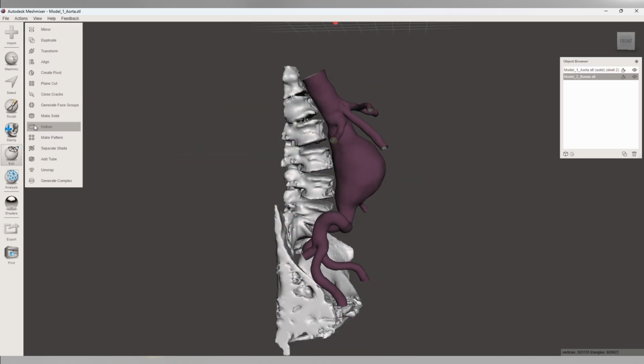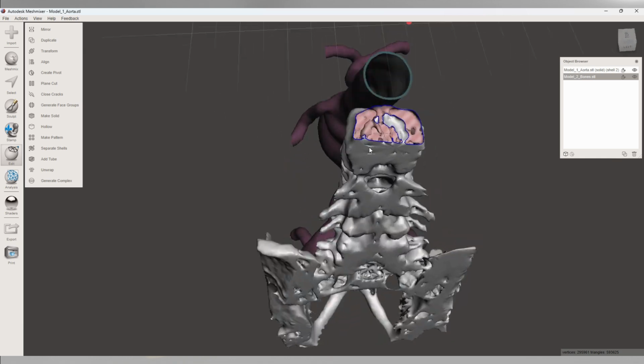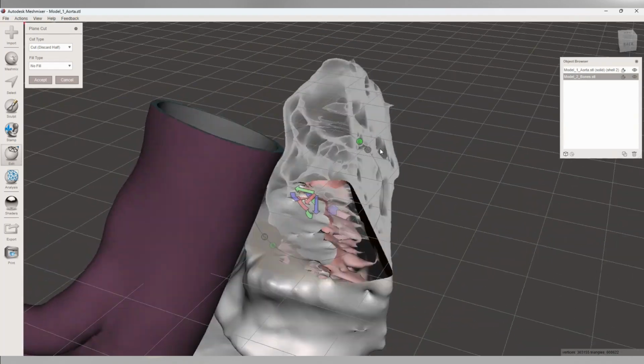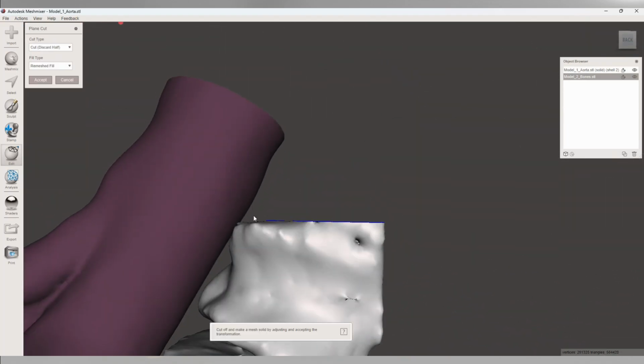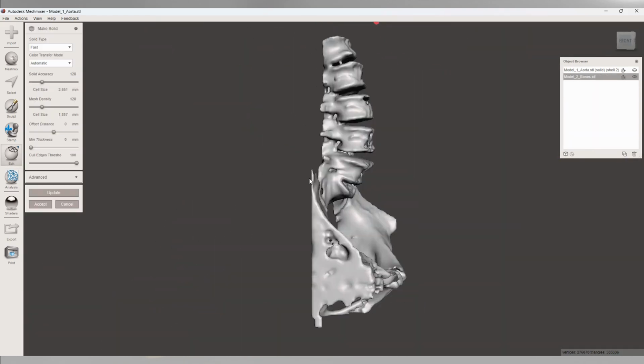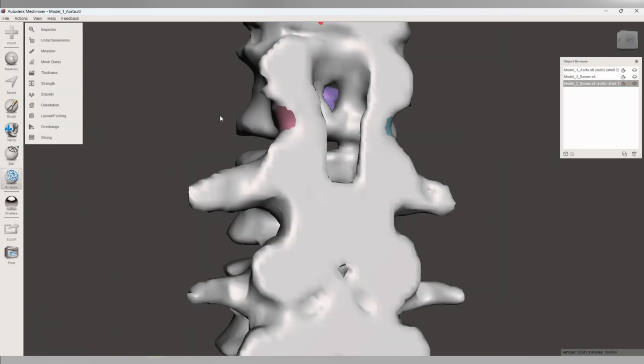The bony structures of the spine and hip bones are also post-modeled with Meshmixer. This part was added to the vascular model as a simple solution for orientation and fixation. Therefore, the level of detail could be lower than in the main model of the aneurysm.